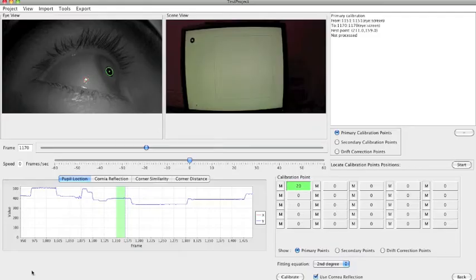Once I do that, you can see that green cross is going to appear on the screen. You can change it as much as you want. Try to be as accurate as possible, although the algorithm does a pretty good job. Once you're done, click done, and now all those points, those 20 frames, are assigned into that position, and you just need to move forward.